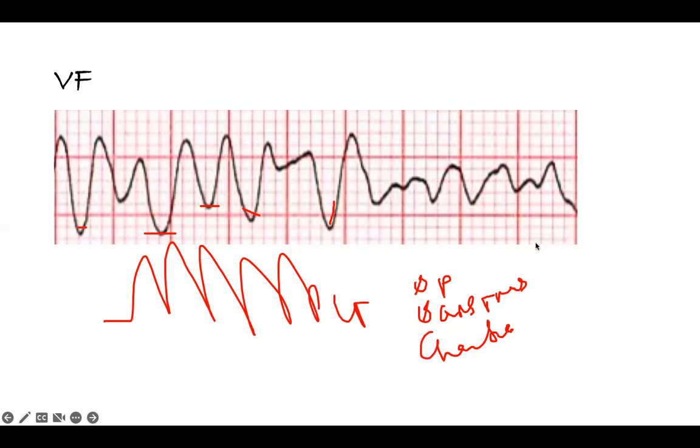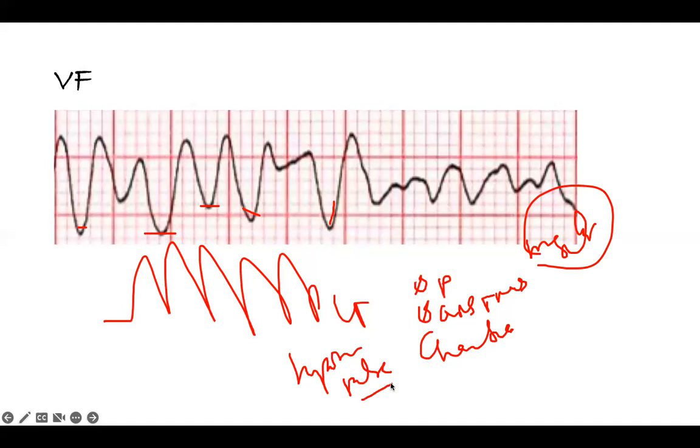This is irregular. There are two irregular rhythms, this one and AFib. So it's an irregular rhythm. I can't even calculate the rate. Basically, the heart is equivalent to not working. That is why they are hypotensive. They are hypotensive and they will not have a pulse because the heart is not doing anything. It's just quivering. There is no contraction at all. It's lethal. The word means lethal. You die from it. So if you see this, defibrillate.